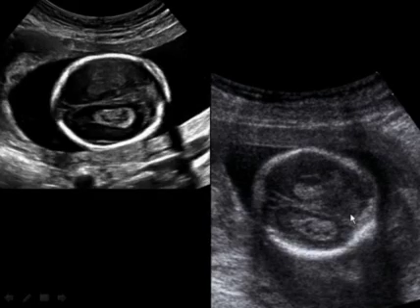Compare those discrete black circles to these 2 fetuses who have a more smudgy, irregular, ill-defined sort of blackness throughout the choroid plexus, but no discrete, well-defined sphere on either one. And these have been termed the spongy choroid, but a spongy choroid is a normal choroid. It does not need to be put into the report, and this head and this head are both normal.